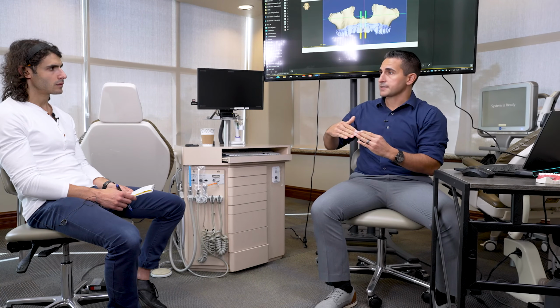And so you have to decide where you're going to place it. A good rule of thumb, just to try to get even expansion, meaning to get the right side to expand as much as the left side, even if it's slanted, is to do exactly like Dr. Lipkin says: put it in with the occlusal plane, with the skeletal plane, just kind of make it even, and then you'll get even expansion. So one side's not expanding more than the other. And then you can deal with the slant in other ways. You can put some TADs on the side, move that whole side up, or use rubber bands to bring the other side down. Right. So that's kind of the workaround now. But if we could predict and get the skeletal expansion controlled to exactly how we want it as we're going, and be able to modify that as the expansion is happening, that would be very significant.